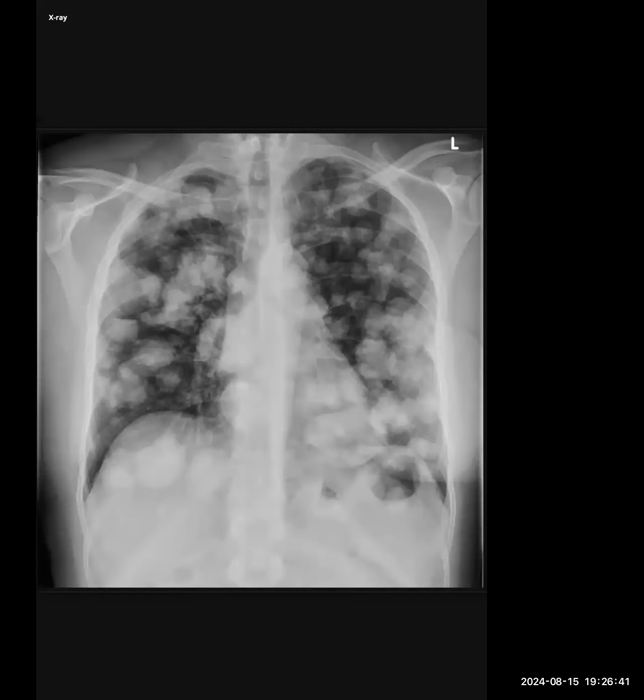Okay, so second one. I am presented with a frontal chest radiograph of a skeletally mature patient. I can see there are multiple nodules diffusely distributed throughout the lungs. I'm just looking at the bones for any destructive lesions. The ribs look normal. The vertebrae look normal. I can see the left breast shadow, but I do not see the right breast shadow. So I think this is a patient who had right breast carcinoma, post mastectomy status. She has presented with cannonball metastasis in the lungs.